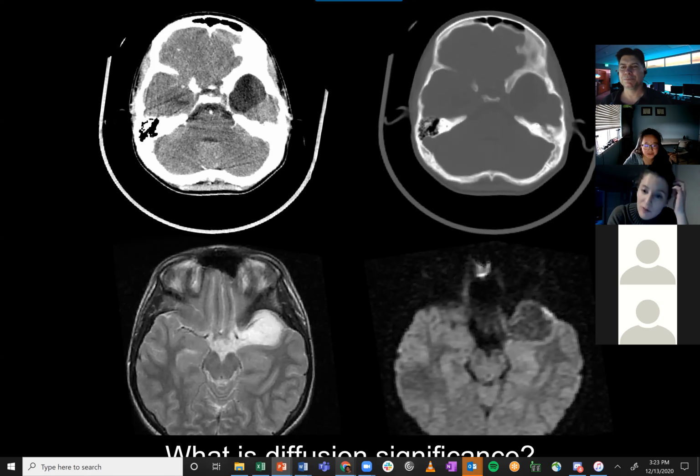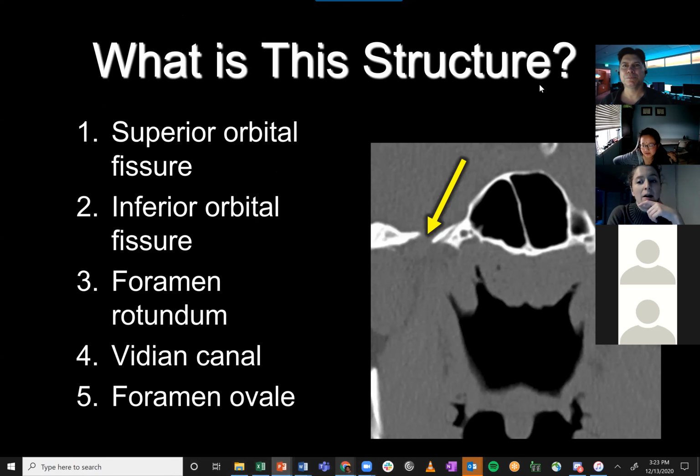Yes. Before you move on, there was a question in the chat about the optic nerve glioma case. Why is the nerve not enhancing? Sometimes it might be because, instead of Schwann cells around the outside of the nerve, it's all glial. Those glial cells are where the tumor may arise. So you may sometimes find the optic nerve going through the optic nerve glioma, and it looks like the outside is all enlarged. So that's where that happens. And just like a glial-based tumor in your brain, it may be a little heterogeneous sometimes.